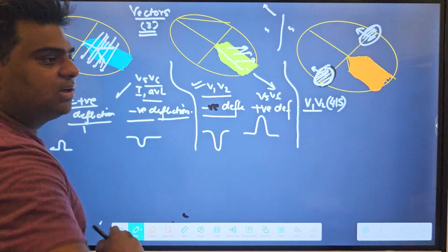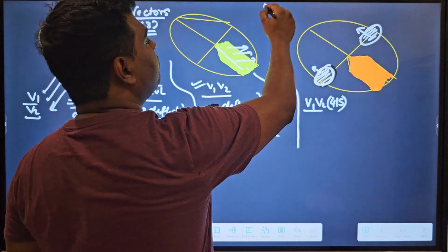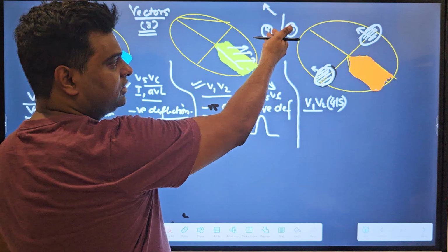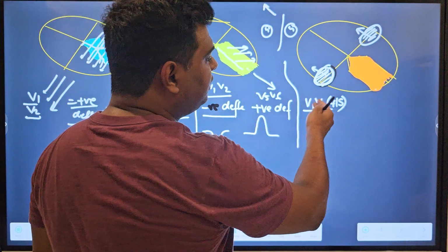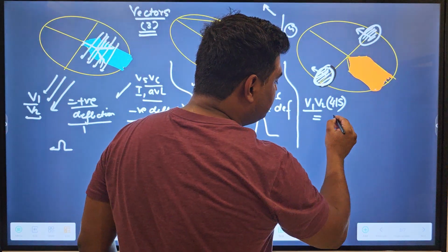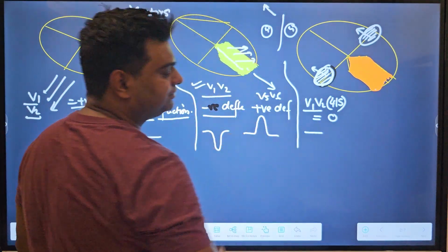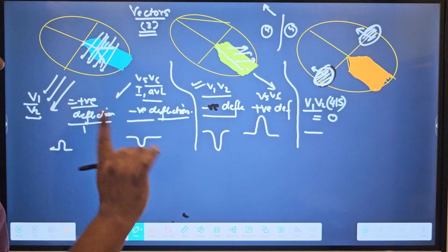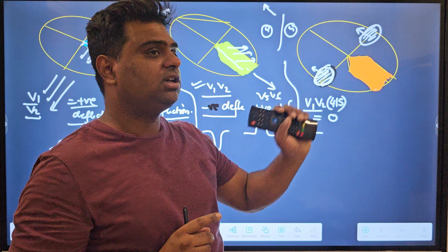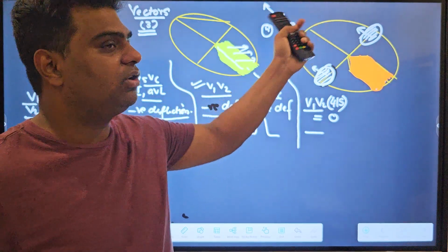So most of the books or papers mention that because this wave is very fast and beyond the scope of the V1 lead, V1 and V2 are not able to measure this basal depolarization. Therefore there is no deflection, that is zero deflection. So they will measure a straight line. Please remember the two causes because of which this basal depolarization is not measured by V1, V2. First, this wave is very fast, and second, it is beyond the scope.